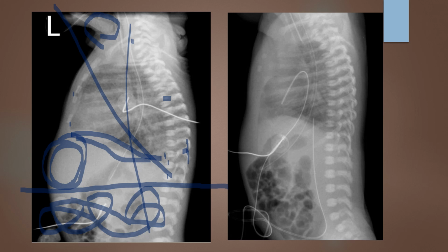Hopefully, just a couple quick notes. Hopefully, you're going to see that they have way undercollimated here, so this baby's genitals are nearly exposed when they don't need to be. You'll also see that they have some umbilical artery catheters coming in here and an endotracheal tube. So look at some of that and go ahead and run through your evaluation on this particular image. You may have to pause.